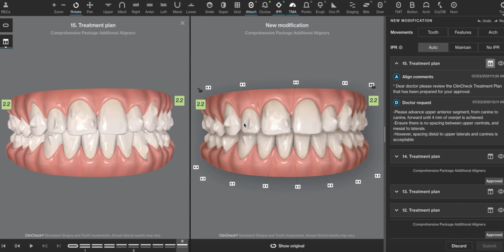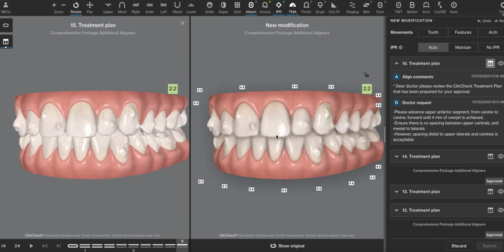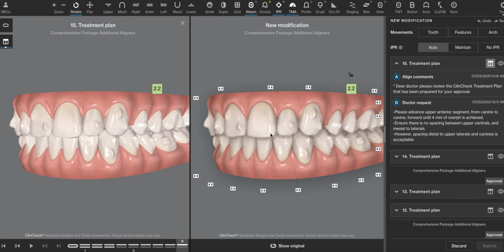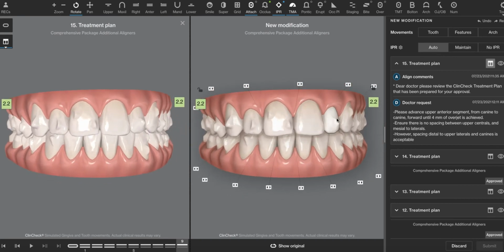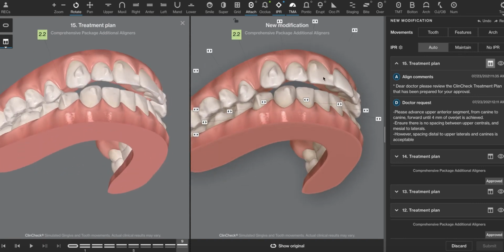And if you can rewind that and go in that order, what that might do is it'll correct the midline discrepancy potentially. If we can do it, why not? And I think this is a good opportunity for us to do so. It will increase the spaces around the laterals to maintain a slightly more aesthetic perspective. It will decrease the overjet to a more favorable outcome without causing some periodontal compromise. And it'll help close this space.